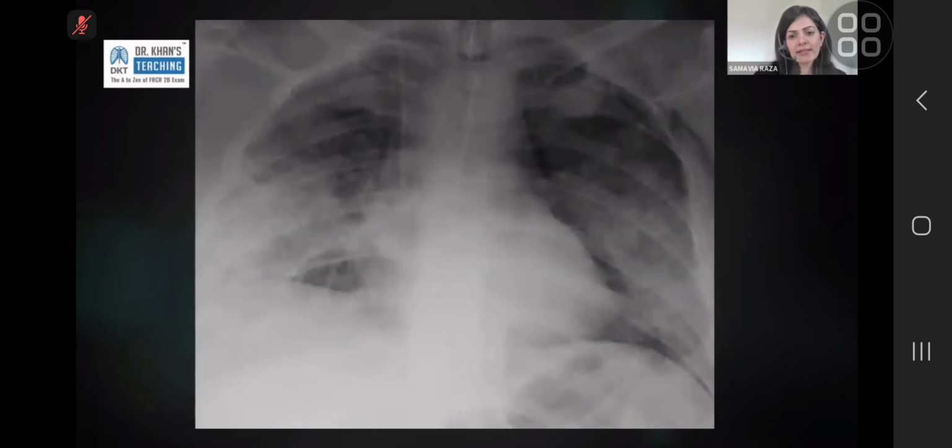So just to put that into some context, this is a film of an acutely unwell patient. You can tell that because there is a central line in, and I'll just open up the chat for 30 seconds just to see some differentials coming in, and then I'll tell you what this actually was.